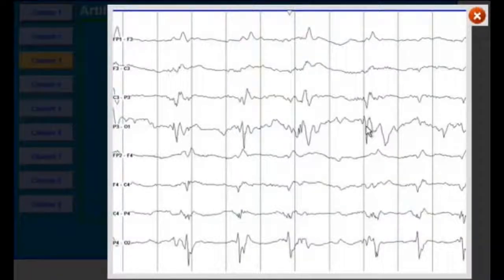So consider the last slide and look at this slide. So you just do not have the spikes here, but you also have a field that extends to other head regions. So from P3 you also see it extend to C3 P3, and likewise from P4 you see extend C4 P4 and even more anteriorly. So these are true epileptiform discharges with maximal negativity in the occipital head region.